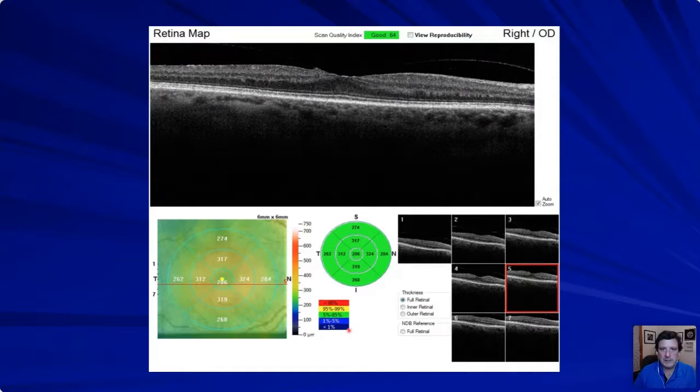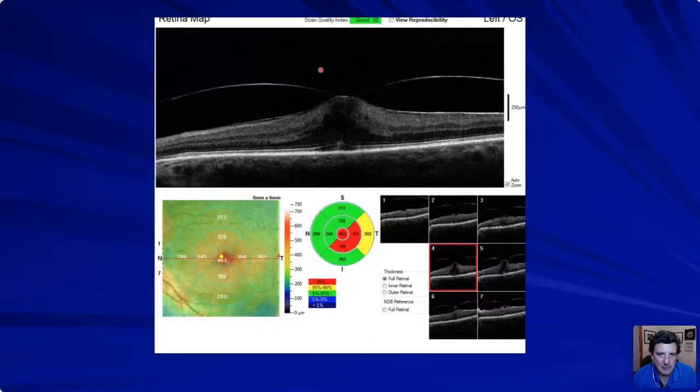And so here's another picture of a vitreomacular adhesion. Oh, no, it's not. It's a vitreomacular traction. Patient's going to have a pretty good acuity, but based on this focal vitreomacular traction, I would probably say that I'm going to check this patient back in 4 to 6 months, give them an Amsler grid, make sure everything's okay. And there's a great chance that this one can just release on its own and all that traction goes away. But we do want to follow them to make sure they're not turning into anything negative, that we may have to get them to a retinologist for maybe a membrane peel if they're starting to turn into a full thickness macular hole.